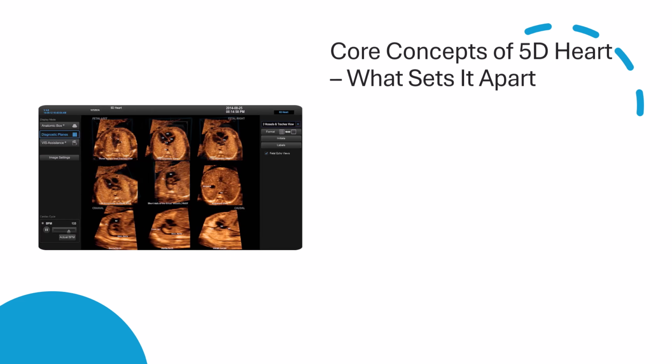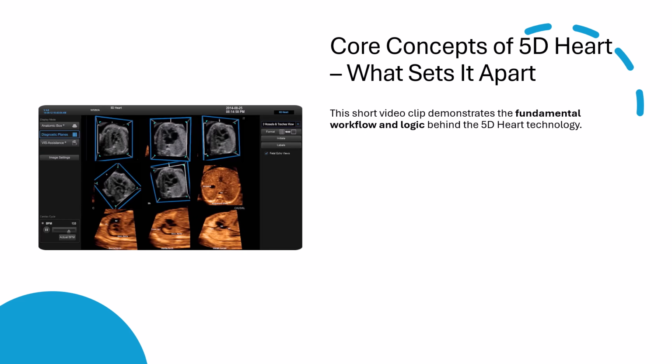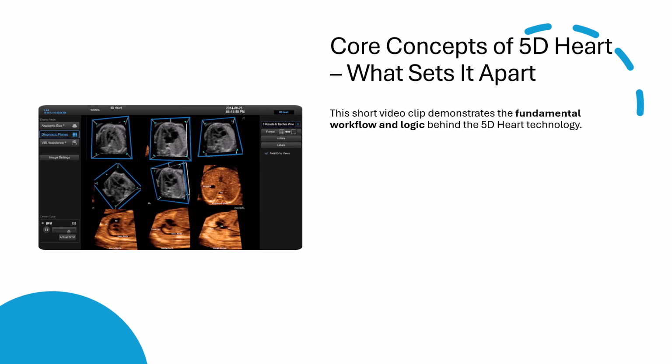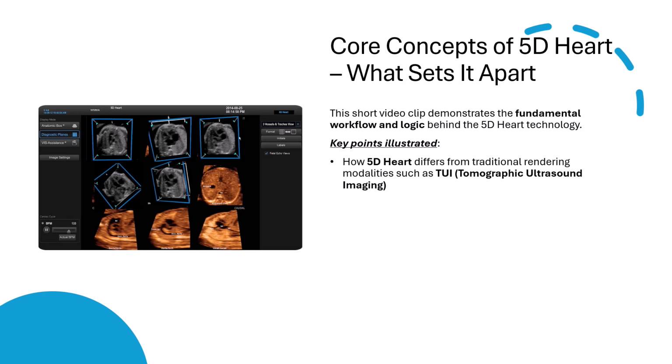Let's take a closer look at what makes 5D Heart truly next gen. This short video clip walks you through the core logic of how the technology works and why it's such a leap forward compared to older rendering modalities like TUI. First, you'll notice that instead of manually scrolling through the slices or toggling planes, 5D Heart intelligently navigates the volume.